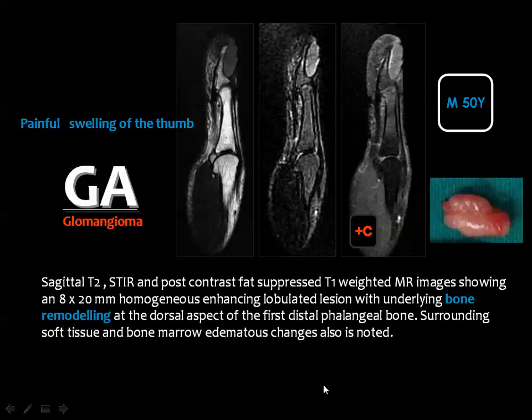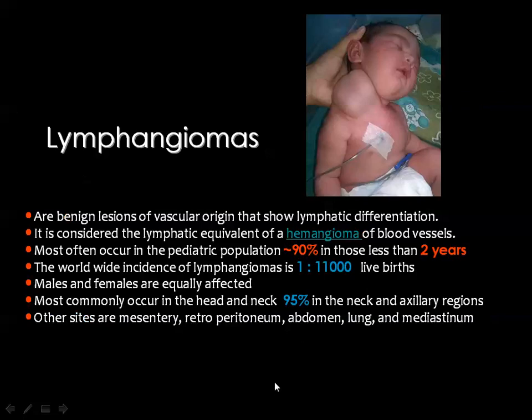due to hypervascularity. And you can call it glomus tumor and you can call it glomangioma, and the tumor is underneath the fingernail. Low signal in the T1, high signal in the T2, and some enhancement after injection of contrast, and you can see its impression on the underlying bone, denoting its benign nature.